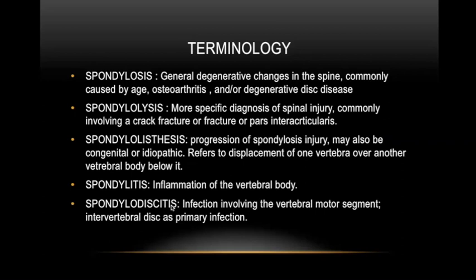Bila dia ada itis yang bawah, spondylitis or spondylodiscitis is usually inflammation or infection. Spondylitis is the inflammation of the vertebral body. Spondylodiscitis is when it involves the intervertebral disc as well. So all this we can see on the end plates. You have the spondylodiscitis on radiograph, tapi most of the time it is an MRI diagnosis lah.